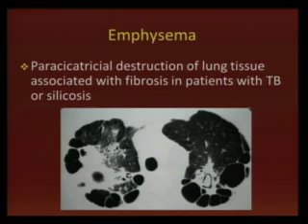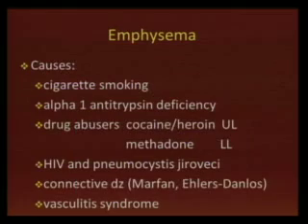That is when there is a chronic disease, like in this case, where we have a patient with tuberculosis, and you can see multiple emphysema or bullous changes. And also in this case we can see a cavity with a filling defect, which is an Aspergillosis.